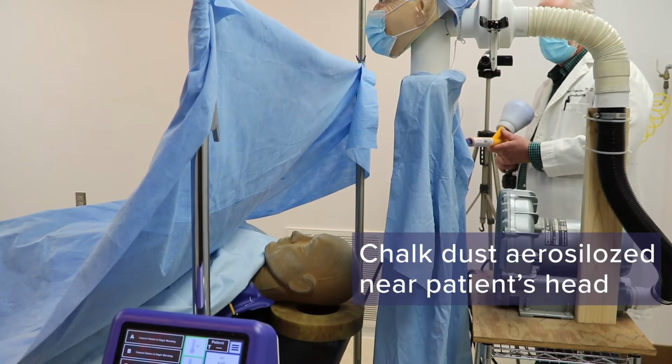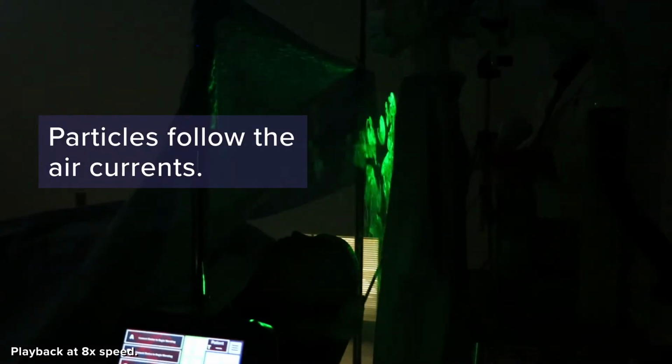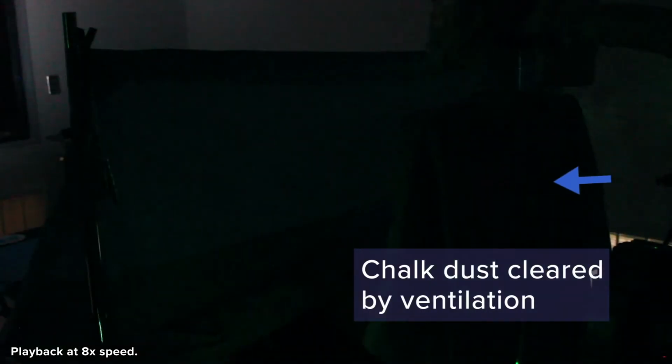Chalk dust is aerosolized near the patient's head under the anesthesia drape. It is sprayed 10 times from the same angle and position as the forced air warming experiment. With no waste heat, the chalk is cleared downward by the laminar flow ventilation.